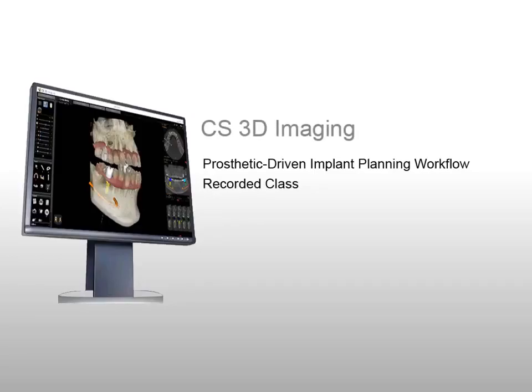CS 3D Imaging, Prosthetic-Driven Implant Planning Workflow Recorded Class. This recorded class is designed for clinical team members. It provides the workflow for planning a prosthetic-driven implant case.